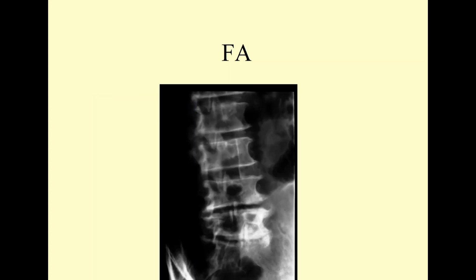Now here's another look at facet arthrosis. Here we have, again, good examples of osteophytes off the vertebral body, and because they're horizontal, they are more likely in the category of a traction type osteophyte. Here, where the hook starts pretty much right at the joint margin, this is a claw-shaped osteophyte. It's important to note that both are stress responses, no doubt, but the claw-shaped osteophyte can appear even in the presence of an intact disc. Traction osteophytes are exclusively associated with disc pathology, disc degeneration.